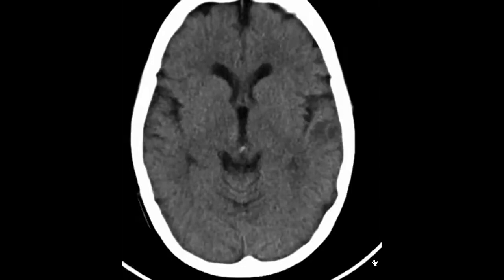This patient, I can also tell you some history. This patient is a 7 years old male patient. He is in the pediatric age group, and he has some earache, and a single seizure. Okay, so you mentioned that maybe it is infarction. Huda, we mentioned already the age. It is a 7 years old patient. So let's have a look at this image.